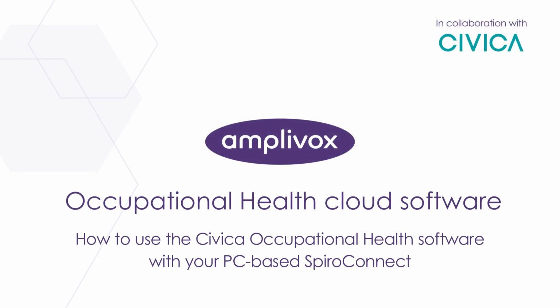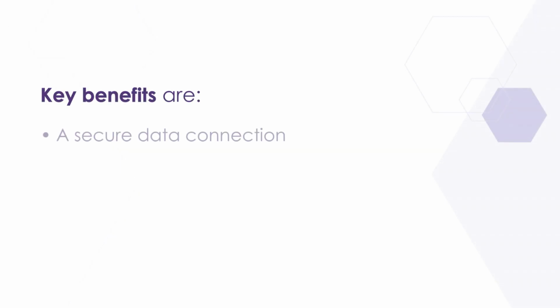Hello. In this video, we'll show you how to use the Civica Occupational Health Software with the SpiroConnect PC-based spirometer. Why should you use the Civica Occupational Health Software integration with your PC-based SpiroConnect?